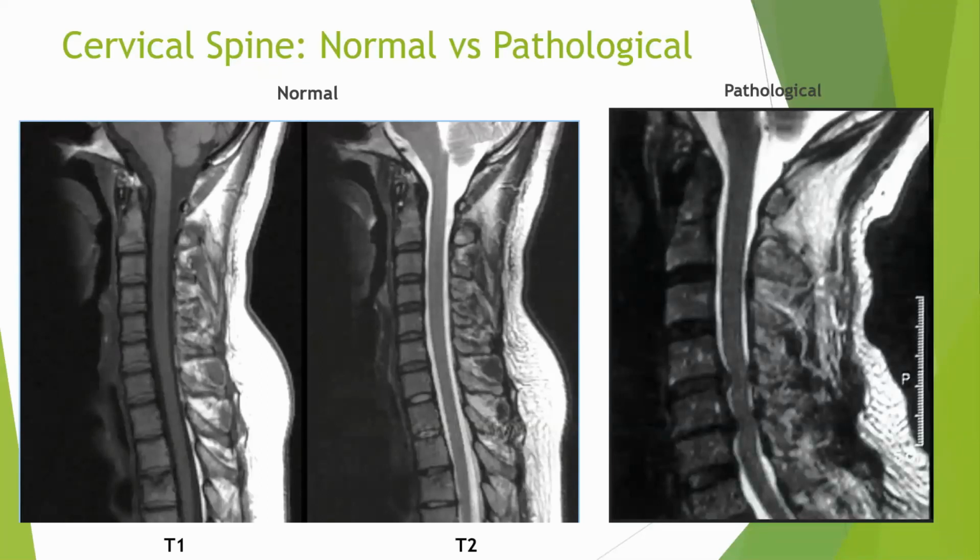Very, very dark, which makes me feel that most of the C-spine IV discs or intervertebral discs are degenerated or in the process of degenerating. So a very, very critical point for you to note is IV disc health. Loss of signal intensity or reduced signal intensity is darker color. Okay, good.